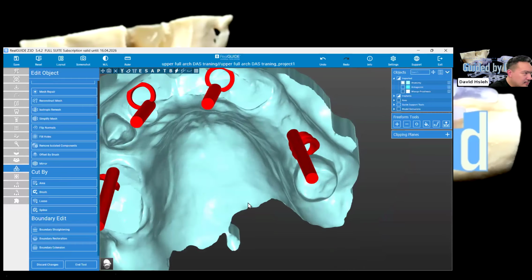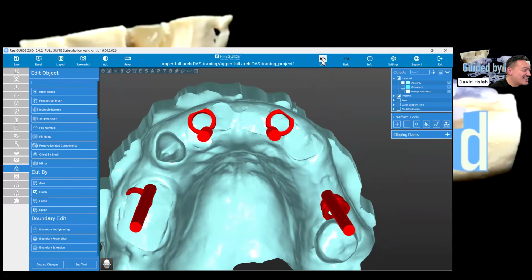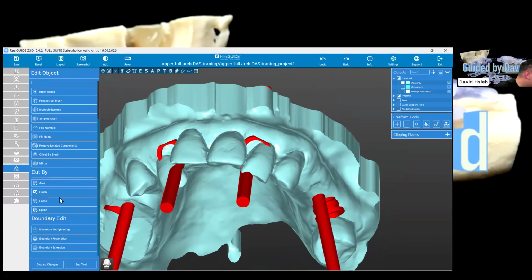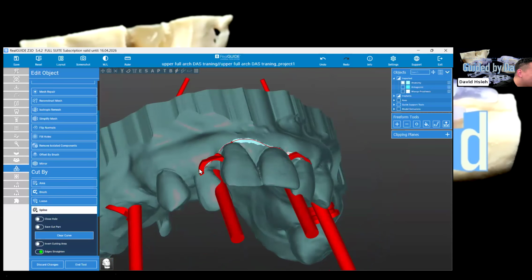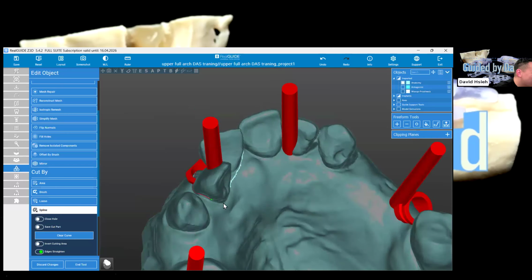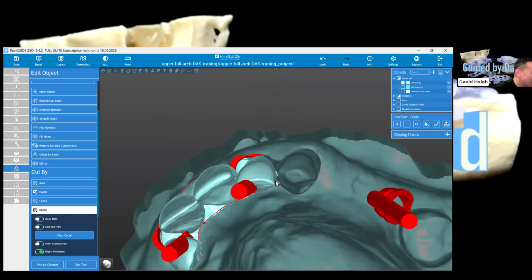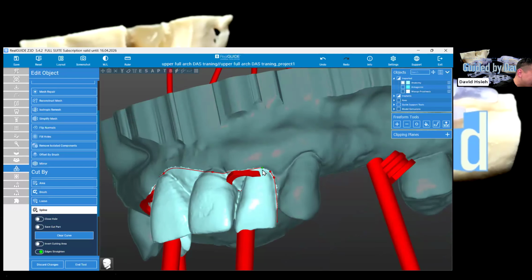All right. Oh, dang, I just accidentally cut the tooth that I need to keep. Actually, the canine. Let's go back a little bit. Sorry about that. So let's try to do that again. I shouldn't remove the canine. That's an accident. You don't want it happening in a surgical chair. So that's another good thing about digital, right? You can always control Z anything.